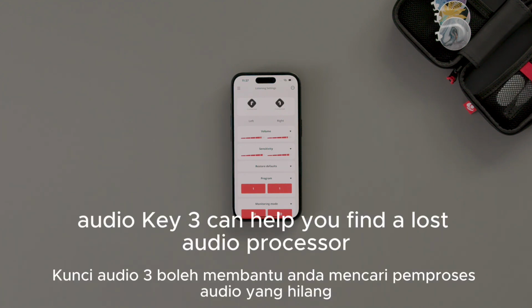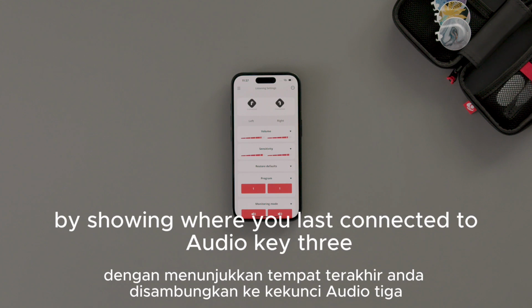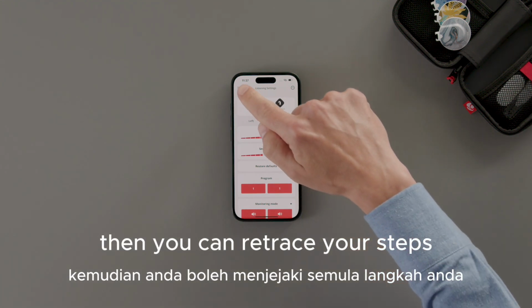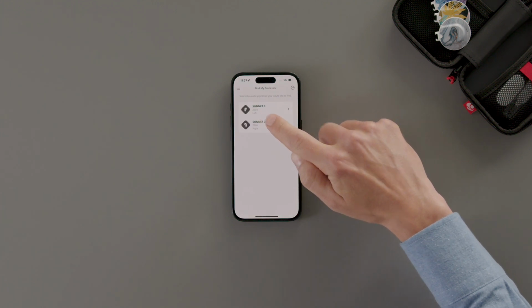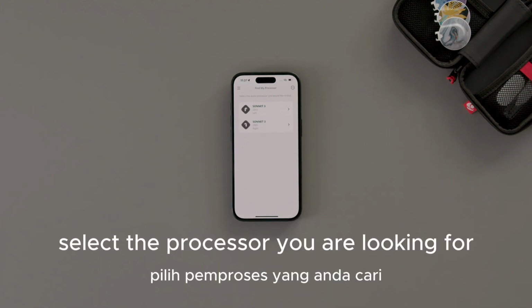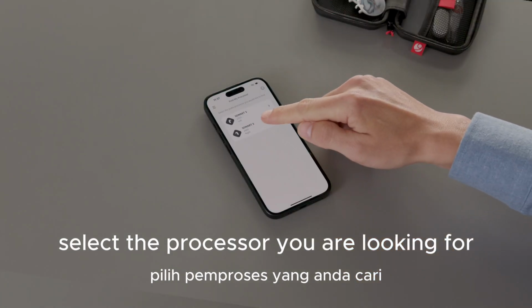AUDIOKEY 3 can help you find a lost audio processor by showing where you last connected to AUDIOKEY 3. Then you can retrace your steps. Select Find My Processor from the menu. Select the processor you are looking for.